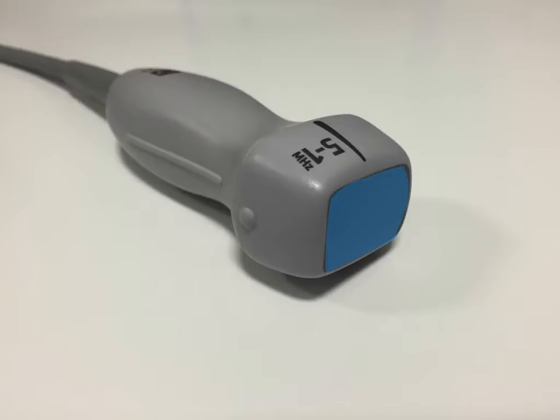So this is a great way for the ultrasound machine to send an electric signal to the probe, generate an ultrasound pulse, and then an ultrasound pulse, when it's sent back, will actually create another electronic signal. So it's a good electrical to mechanical converter and vice versa.